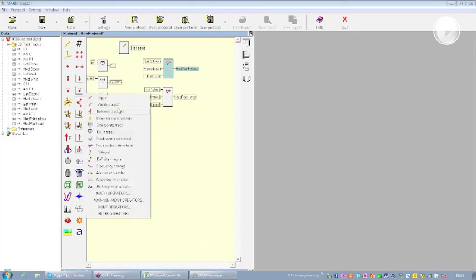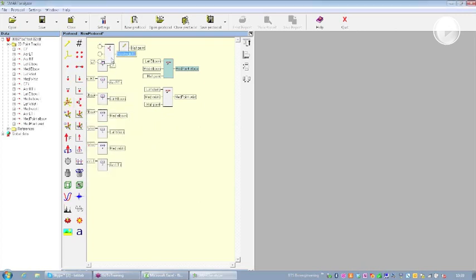I have my 3 points: acromion, medial elbow point, and medial wrist point. So I just drag and drop as we did to create this angle. So acromion on the right side, medial point elbow, and medial point on the wrist. You can see this is a 1D angle, so it's going to be 1D flex extension.